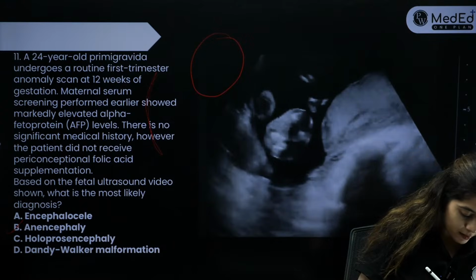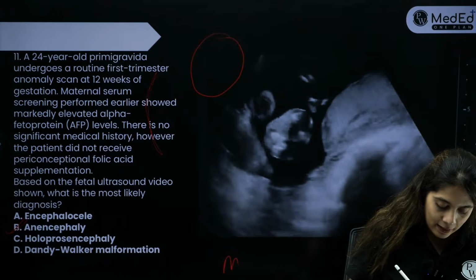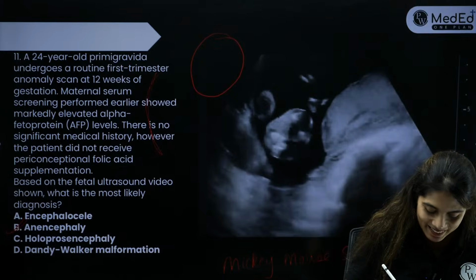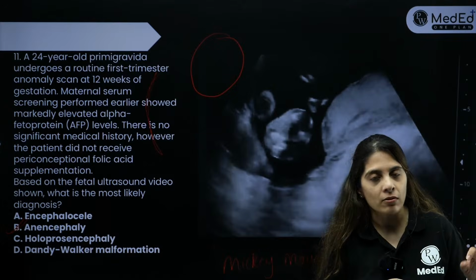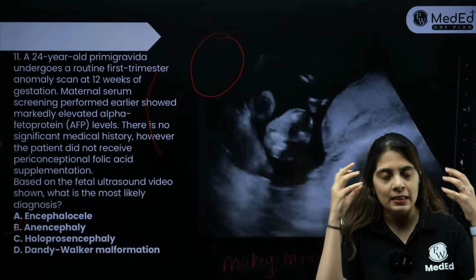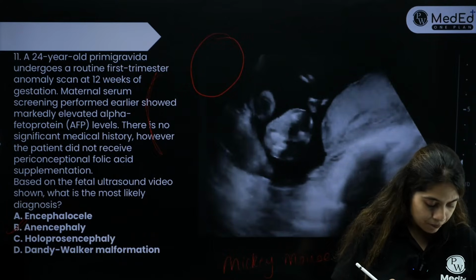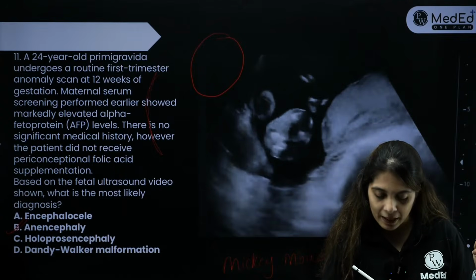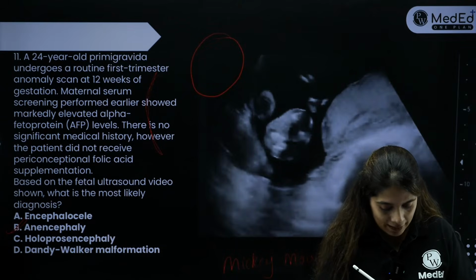So the answer over here is anencephaly, and you get the classical Mickey Mouse sign. I didn't get any answers, but this is a very classical hot favorite question. Apart from the frog eye sign, you can get the Mickey Mouse sign because it resembles Mickey ears when the protruding brain tissue is seen whenever the skull is absent. So that is the second sign. No, Shantanu, it's not lemon or banana. Lemon or banana we have already discussed when we were discussing the myelomeningocele.